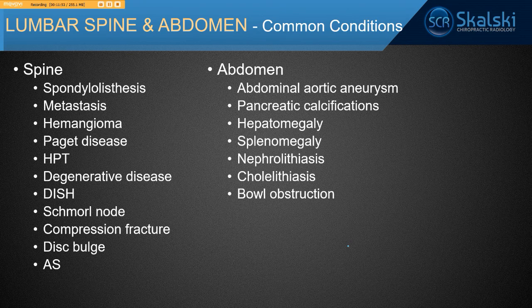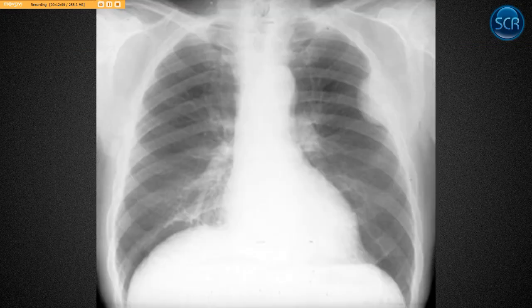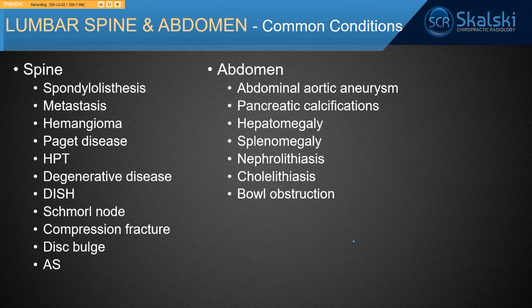All right, so that's the quick overview of the thoracic spine and chest stuff that you might encounter on boards. Hopefully that's helpful. I'm just scanning through some cases. I don't know why. So I want to stop this video and start a new one for the lumbar.